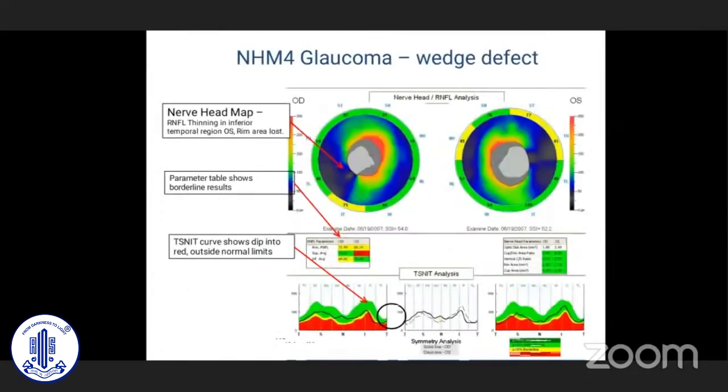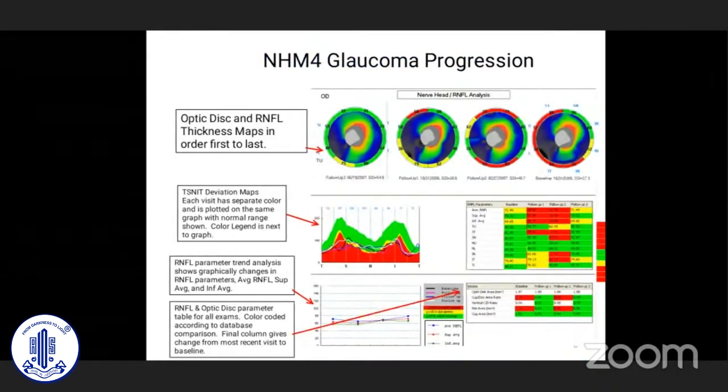You can still see in this the right and the left OCT of a patient where again the inferior and the superior parts are thinned out, just a reinforcement of the same. I told you that you don't always get such classical OCT images.